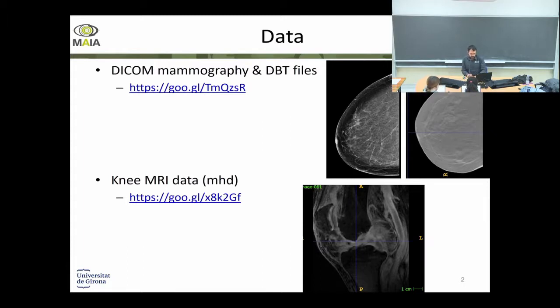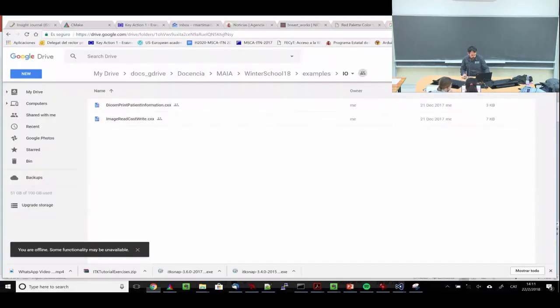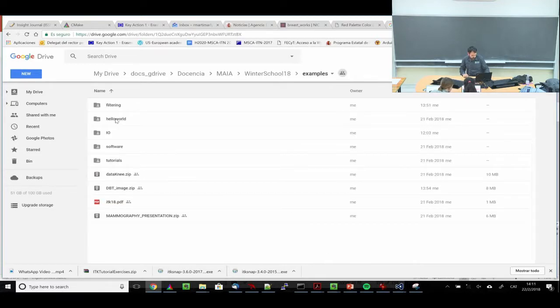The images, the examples, and everything is the same link in the Google Drive directory as yesterday. In case you don't have it, it's this one. Okay, well, you have it in the... No. If you download the PDF, it's in this. It's already in the same place as yesterday. Okay. If we click on this, it will go. Well, this is my directory. Well, you'll see something like this, probably. I don't know if you see it.